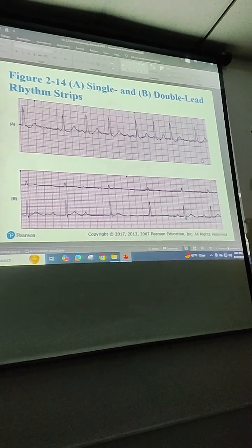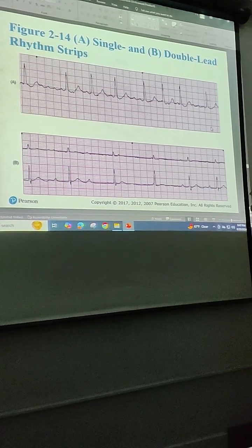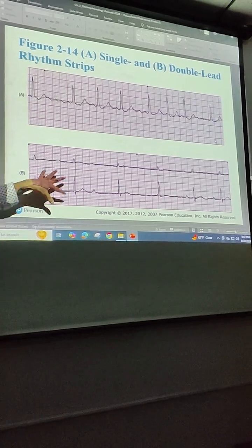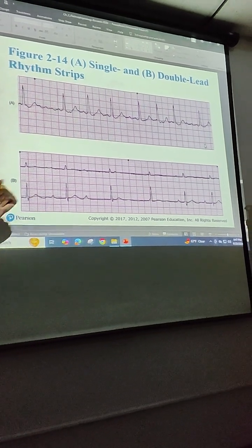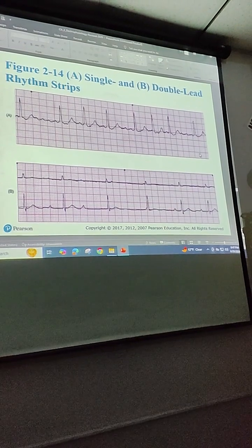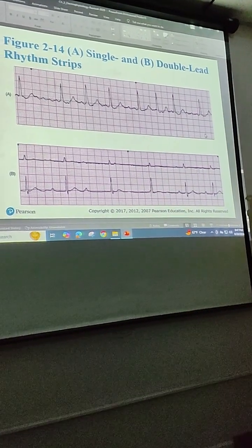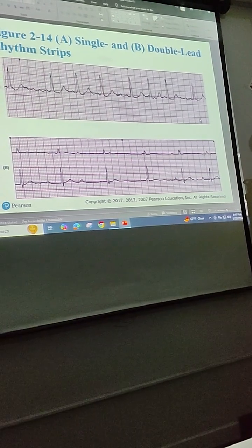Reading an EKG is difficult, because it's not going to be nice and sweet like we saw on the drawing. In a real EKG, this is what you're going to encounter. That's why medical assistants don't need to interpret this. You just do the electrocardiogram, have the printout, and give it to the doctor, and he will start enjoying that. Not you.